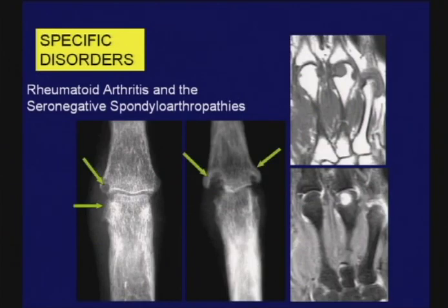become quite prominent. Here's an example with conventional radiography showing progressive marginal erosions of rheumatoid arthritis, and in a different patient, I show you what these look like with MR imaging. Yes, in the years ahead, I think MR imaging will become the modality of choice for rheumatologists to assess rheumatoid arthritis. It's already happening.